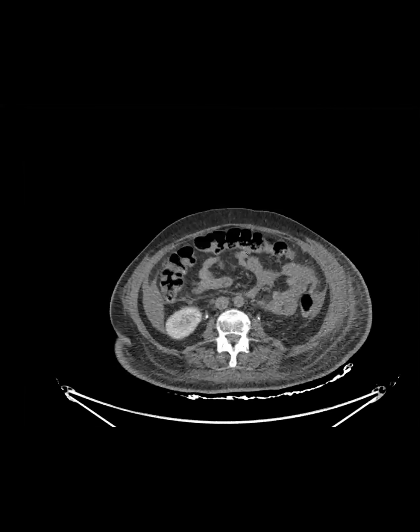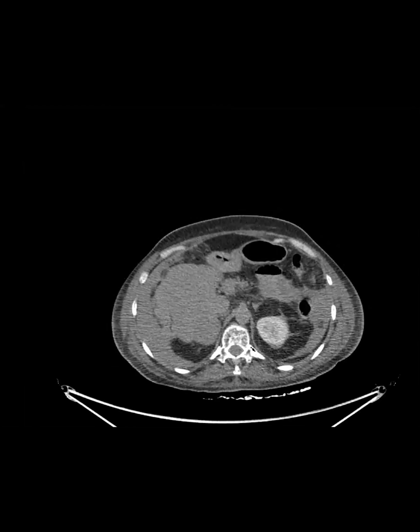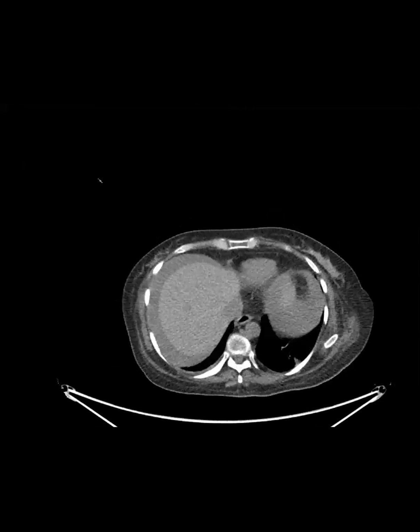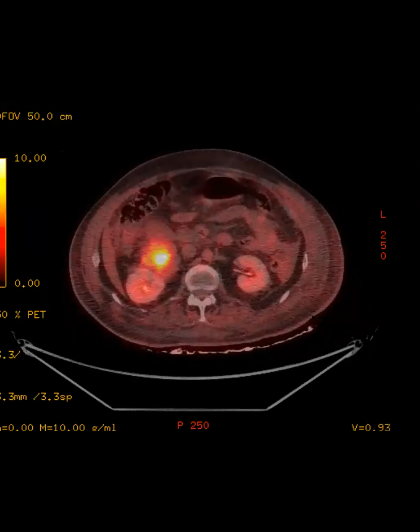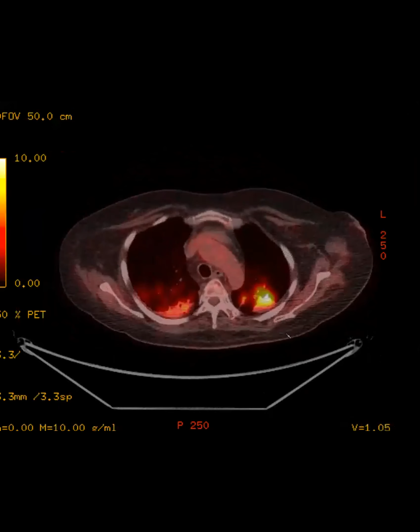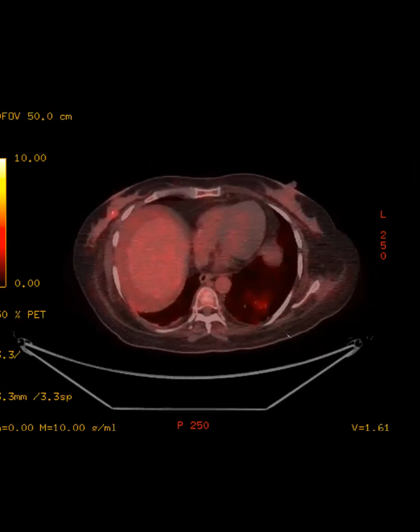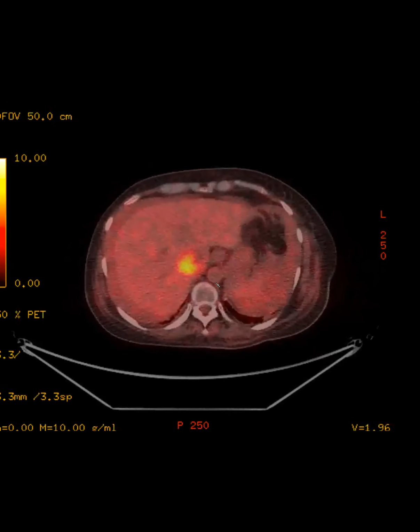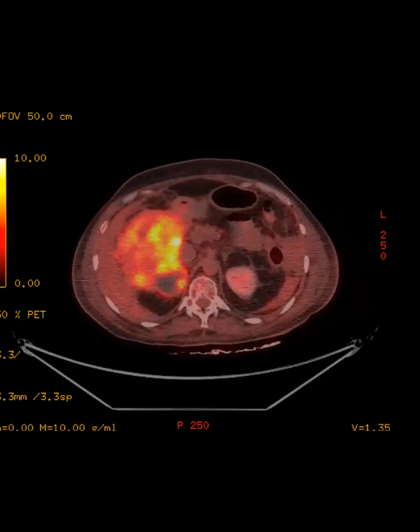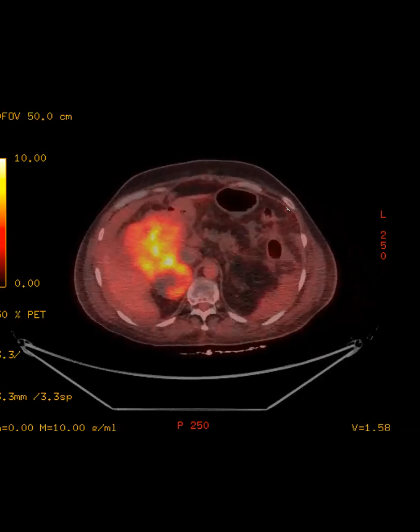So a couple of things to note on the PET. First of all, they did not have a calcification in the lesion, so that did not help us for ACC. But this was the PET CT. You can see that the patient had these patchy FDG avid opacities that were compatible with COVID. The adrenal cortical carcinoma was also fairly avid, which is typical, except for this area of central necrosis. And the omental stuff was not avid at all.